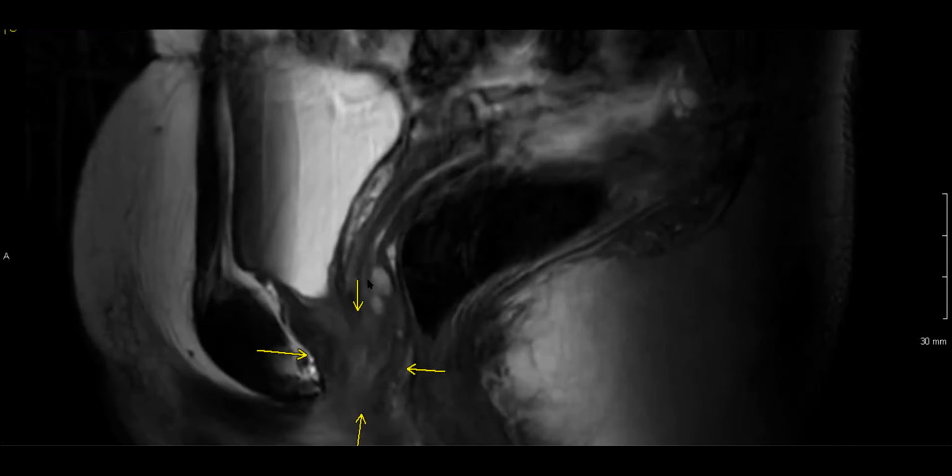So they're going to probably do a high resolution assessment of the area so we can get a better idea. But that's what it sounds like. And we looked it up, and this urethrovaginal sinus is very rare, but it can be associated with other uterine anomalies, including this cool thing. So that's my first cool case.